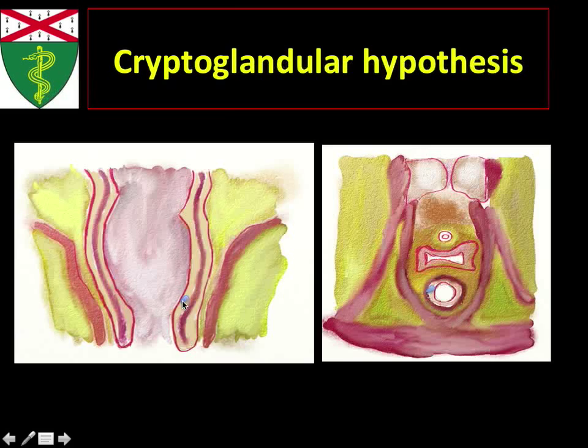And one thing you'll find in the human body is that whenever something's under a little bit of pressure, it finds a way to decompress. It doesn't like to be under that sort of pressure. And so we can see another anal gland in the axial plane over here, and it is how that gland decompresses into the adjacent areas of the anus that determines the types of fistulas you get, the types of abscesses you get.